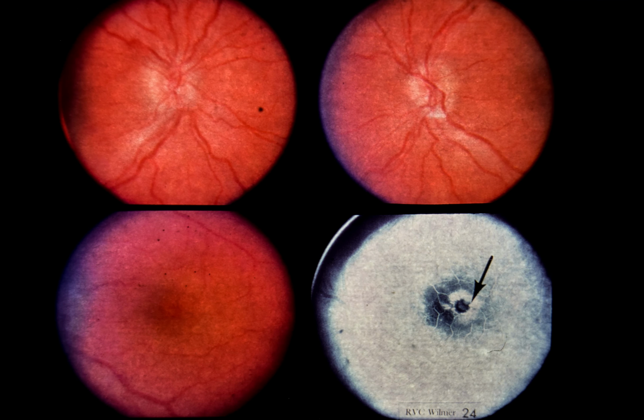Slide 24. Optic disc edema and pars planitis. This 15-year-old female complained of decreased vision in both eyes and occasional mild headache. Visual acuity was 20/30 OU and both optic discs were edematous. Because she had good vision and bilateral optic disc edema, her initial ophthalmologist thought she had papilledema, and she was referred to a neurosurgeon for further evaluation.